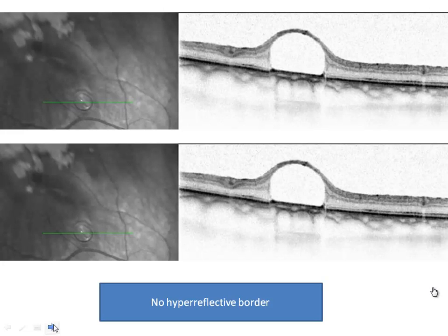In contrast, we're getting something a little bit different here. This patient just had retinal detachment surgery and had one of the various oils in the eye, silicone oil, a bunch of different gases and oils that are used in various types of retinal detachment surgery. And somebody noticed this and we just took a slice through it. So this is actually gas.